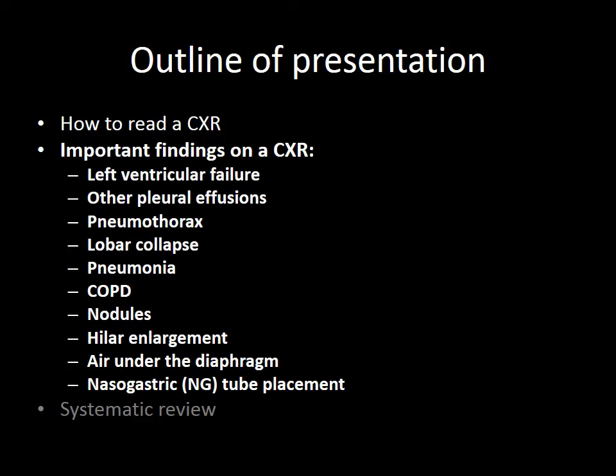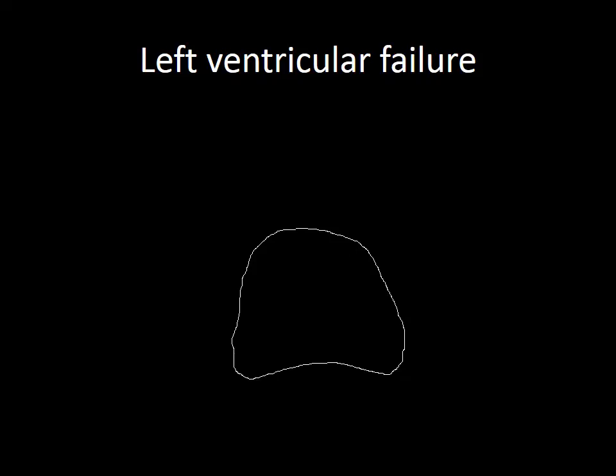Now you know how to read a chest X-ray, I'll now explain how you can spot important findings. Left ventricular failure. Left ventricular failure is characterised by 4 chest X-ray findings.